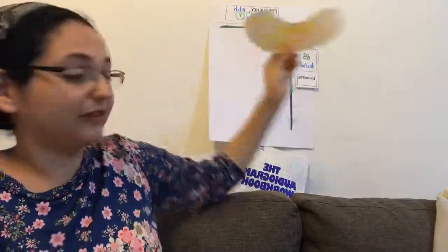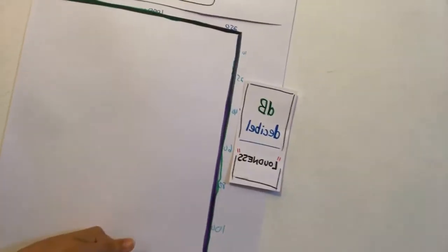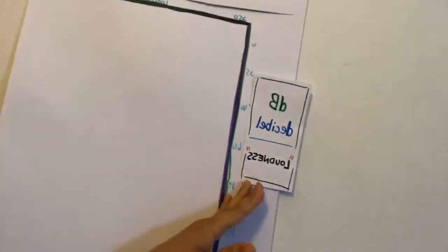So for a quick review, and I'll bring you just a little bit closer to here. The top goes from low frequency to high frequency, and going down, you're measuring in decibels, getting to the loudness.